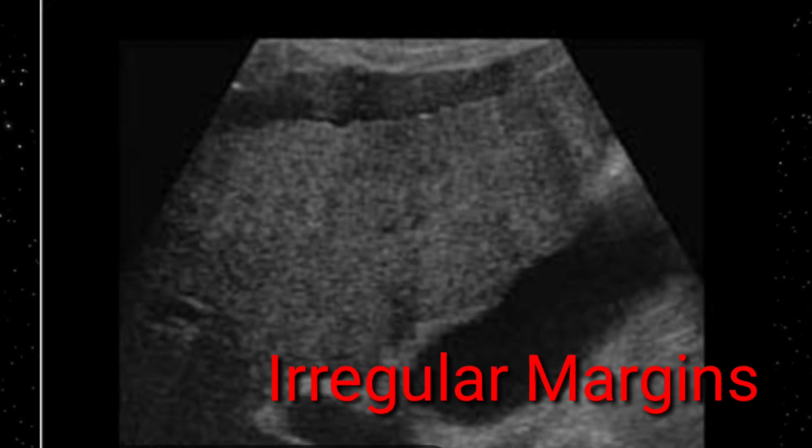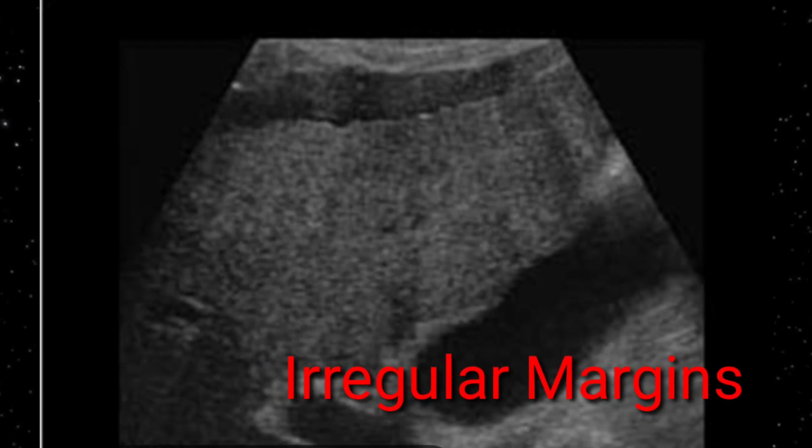The next appreciable sign would be irregular margins of the liver. Look at this image, which clearly shows irregular margins. Its superior and medial borders are irregular, although you can appreciate ascites around it, which is also a confirmatory sign. So if there is coarseness of the liver, irregular margins, and ascites around, these are three characteristic signs of liver cirrhosis.